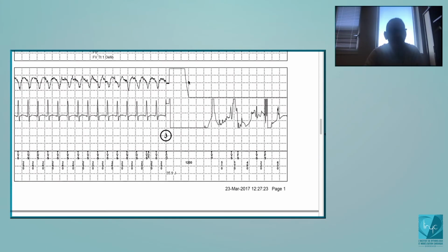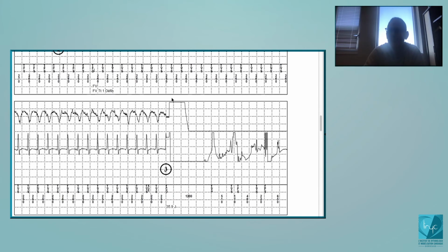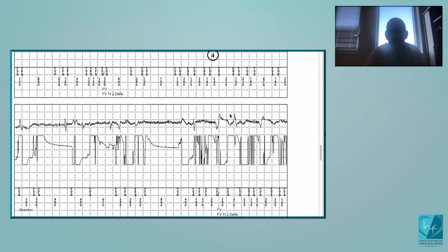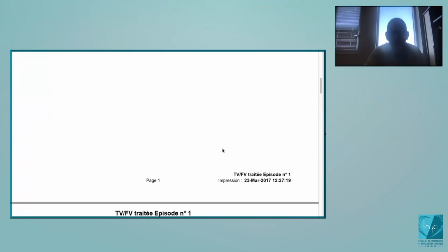Before that, the impedance was normal, and we had never seen this kind of signals, but then we changed the box of the device and retested. This was a specific lead, a Fidelis lead, and this Fidelis really revealed the lead dysfunction. But once more, on the plot, it's obvious.